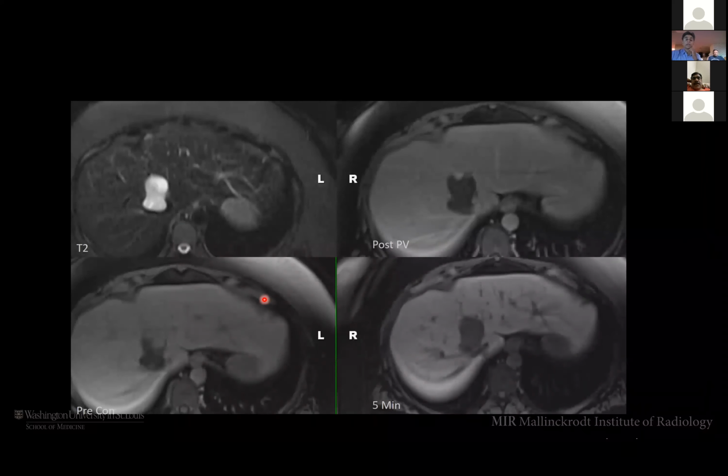Okay. A word of caution, or just a reminder: we all use the hepatobiliary contrast agents, right? Like the MultiHance where we do 1 hour delayed images, and the Eovist contrast that we do 20-minute delayed images, where there's excretion of the contrast into the biliary ductal system. This is a classic hemangioma. But if you have a very classic hemangioma and you use a hepatobiliary contrast agent, you may not have enough time to fill the lesion and for the lesion to take up the entire contrast.